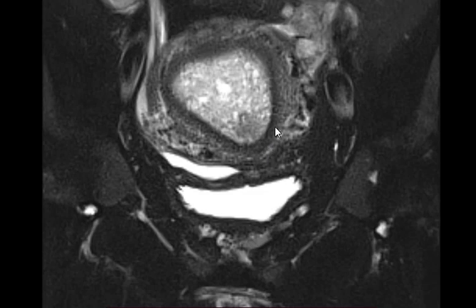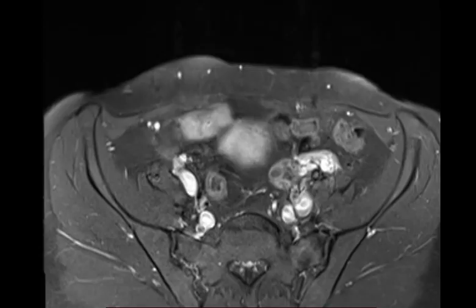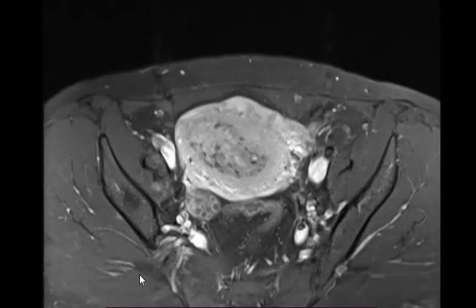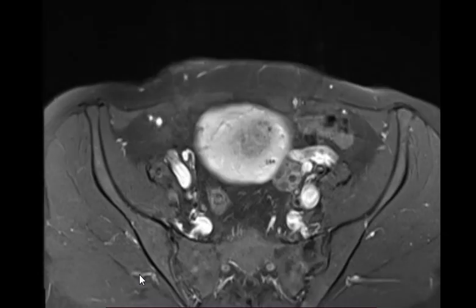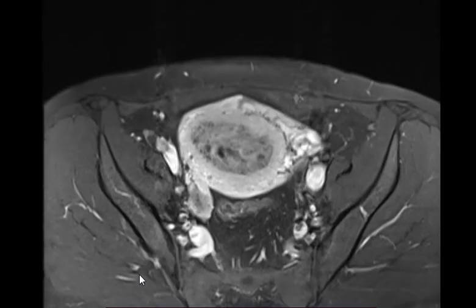Sometimes with contrast, first, I'm not sure, I was not sure about the pregnancy test when she came first. Second, she says I don't think I am pregnant, but she is pregnant. After we demanded the pregnancy test, we knew that it was positive. After the MRI, we did the pregnancy test. For example, if it was invasive, so we would see the lesion in the myometrium going through the junctional zone.